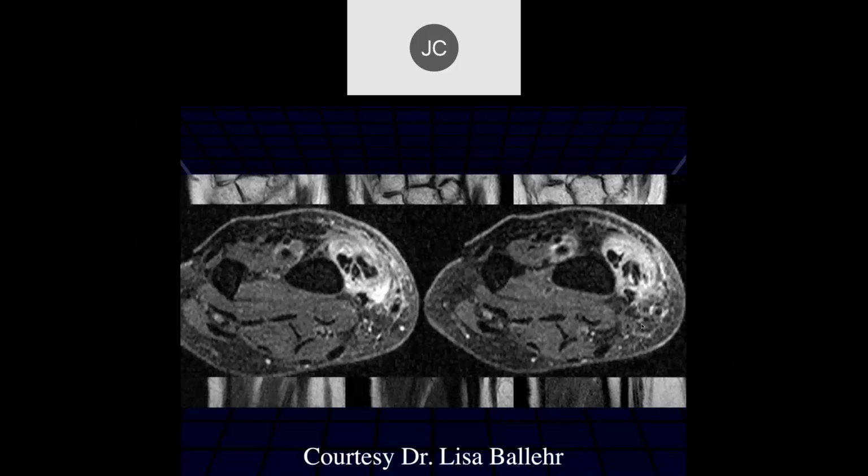And what do you think about the axial images? A lot of synovial thickening there. And maybe a partial tear of that abductor. The tendons look like they're partially torn here, maybe some longitudinal tears, and this was coccidioidomycosis.